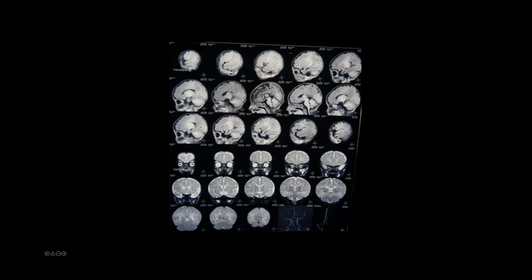No malformations. Coronal images are again similar to the axials. Maybe a slight degree of cerebellar volume loss, but not very significant. The posterior fossa structures demonstrate normal volume. So on the imaging, at least I could say there's probably a slight degree of hypoplasia of the corpus callosum.